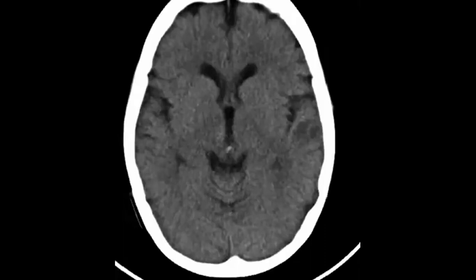I don't mind if someone wants to unmute himself and share in voice if it is good for you. But I would like you to train yourself in how you describe. Try to describe in radiological terms, like you are in a session where you want to report this image in practice. So for example, you should mention the location and how it looks.